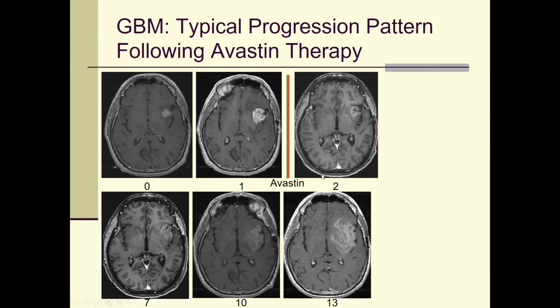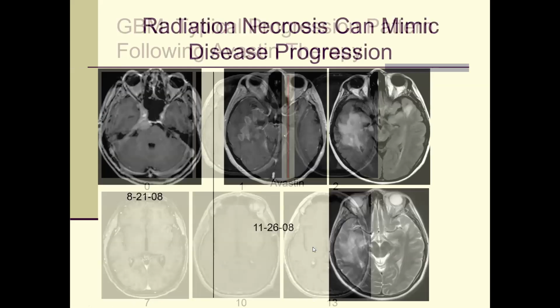But as you can see from here to here, enhancement is increased and continues to increase into the much deeper area. But it's never a very bright signal intensity. So the entire thing can be very effaced, but you have to very carefully assess the extent of the disease process.